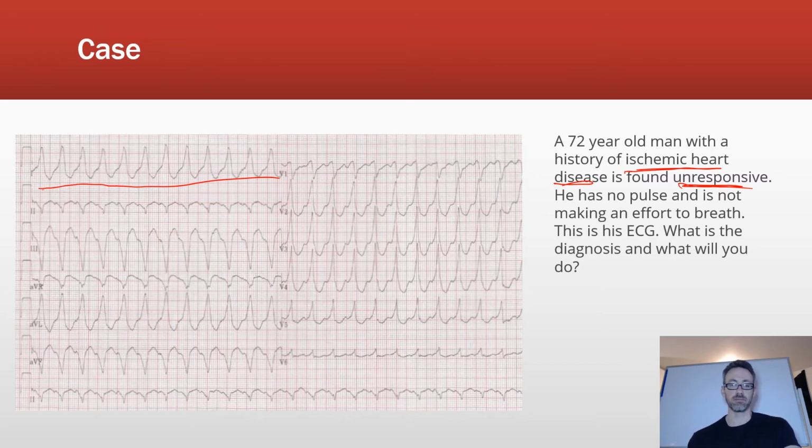It is tachycardic. And sometimes it can be confused with PSVT, paroxysmal supraventricular tachycardia. And in a clinical context, it's actually easier to tell them apart because usually VTach occurs in older patients. They may not even be responding, in which case it's a diseased heart and there's something going on with the cardiac output and so on. Whereas in PSVT, this can happen in any age really, but you might even see it in younger patients, for example. And you could break a PSVT with a carotid massage in some cases, or adenosine, whereas that wouldn't help in this scenario.